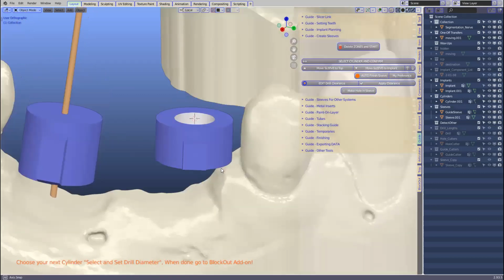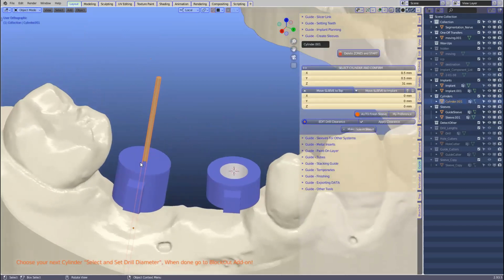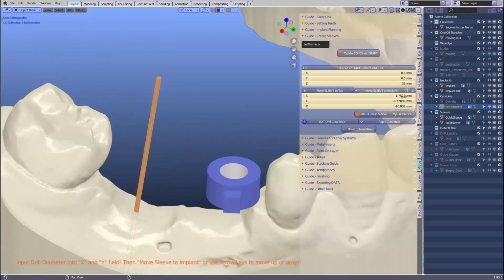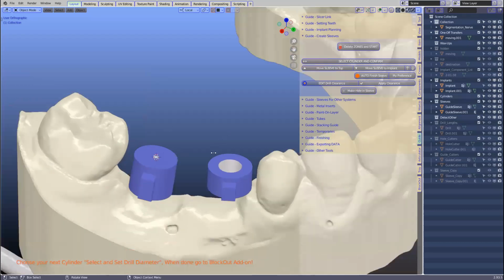Okay. Now for this one, I'm going to use an insert. If we use an insert, we're making a hole first, and then we're making another hole. So there's no purpose in making this a big hole and then coming with your insert, when the insert is smaller than the initial hole. So keep this hole small. We're going to put our offset of whatever it may be. I'll just put 9 millimeters. And I'm going to now click auto, and it'll make a hole. It'll do exactly those 3 buttons.